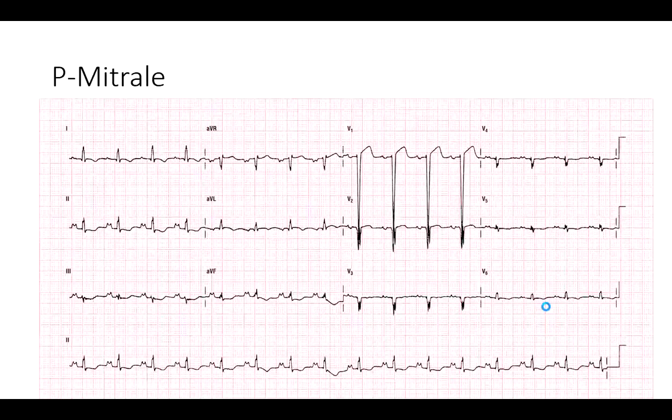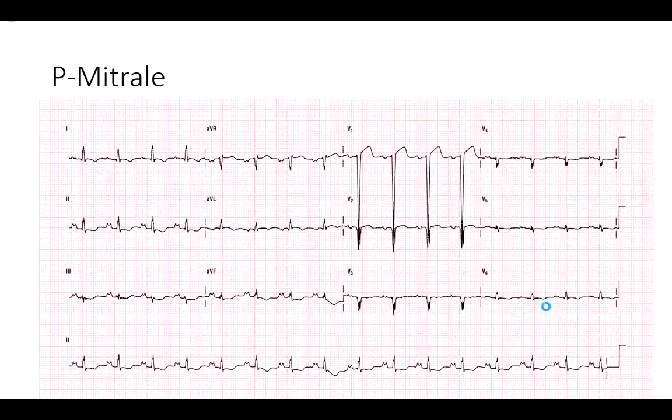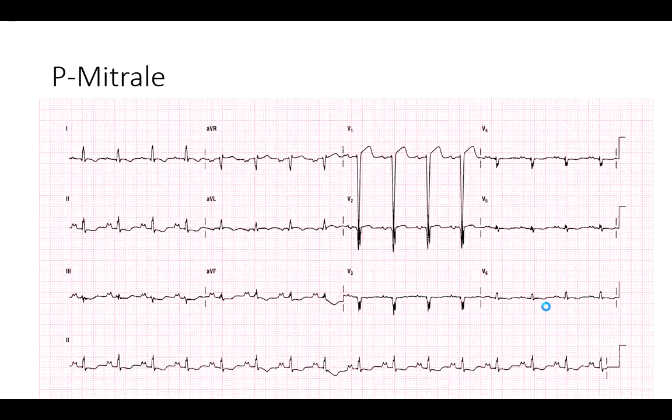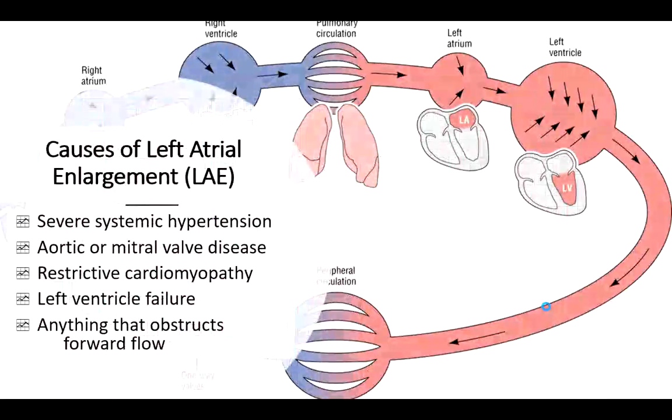Or maybe before I set up this 12 lead, the patient told me this is what's going on. And I started in my mind thinking, okay, what might the ECG look like? What am I wanting to confirm? Then I set up a 12 lead and I go, oh, look at this, look at this, look at this. That all matches some of these symptoms that this patient's having. Folks, the ECG is fascinating. Look at this, causes of left atrial enlargement.